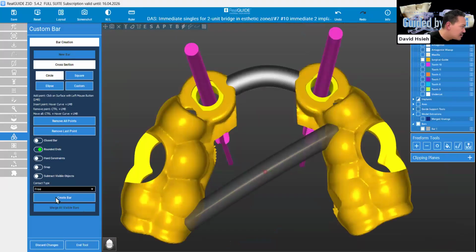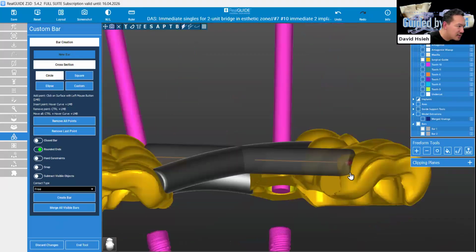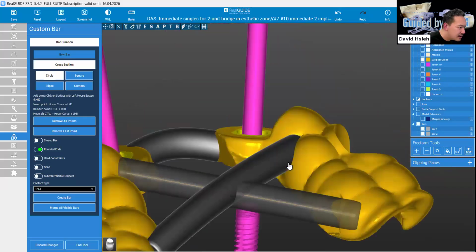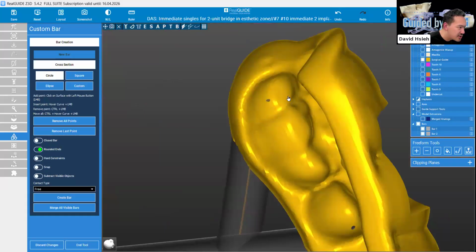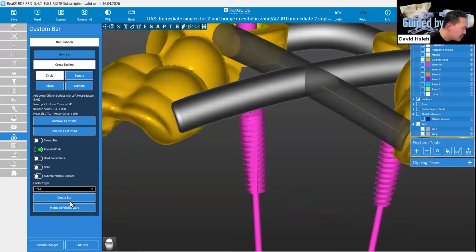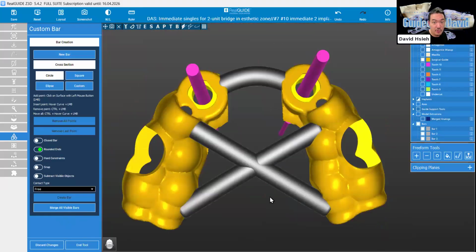Let's hit create. And then let's hit another new bar right there. And just create another bar right here. We're going to do the same design right there. Let's check. Okay, this is protruded inside. Let's drag it out. See here, there's nothing there. That's beautiful. And then just create bar. Now we have created 3 bars. Then we can reconnect the guide back into one, right?